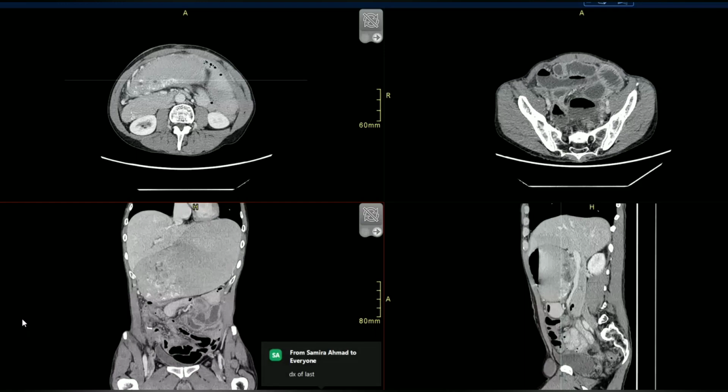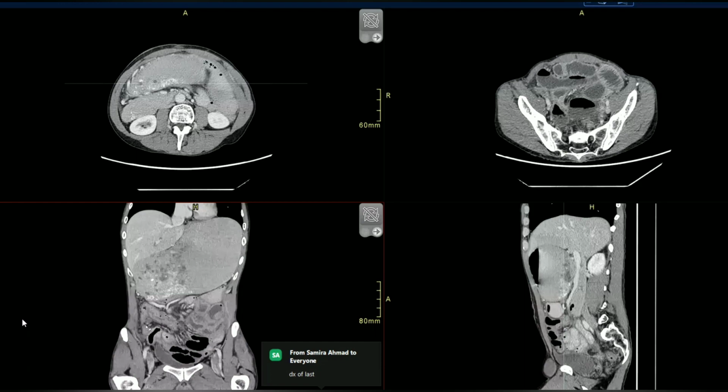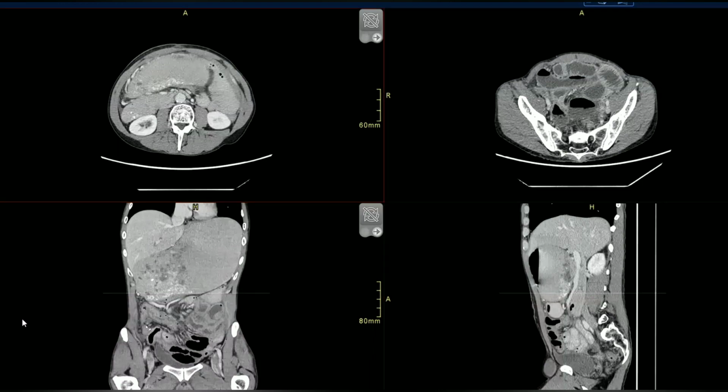Okay. Ma'am, in the differential, you want to ask? I've given my diagnosis of annular pancreas, and so, okay. The other, it can be, ma'am, any intraluminal lesion, which I cannot see over here. No. Ma'am, this is on this image.